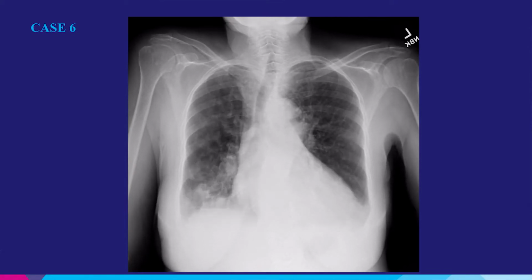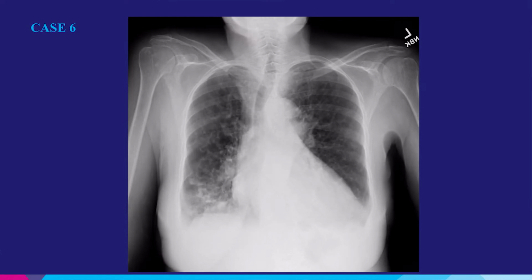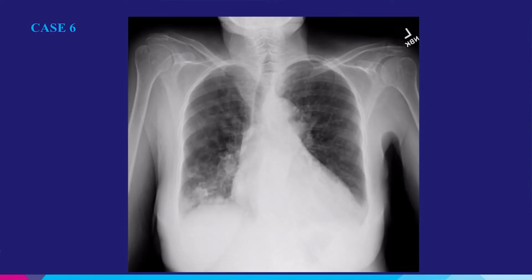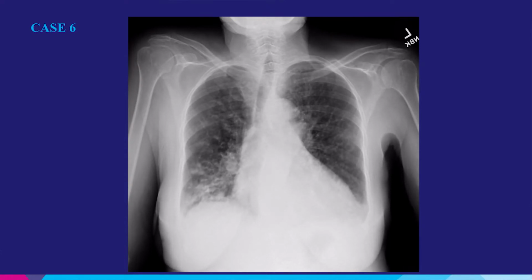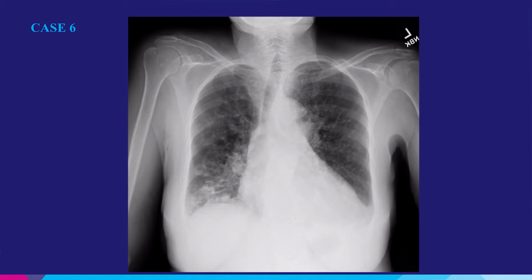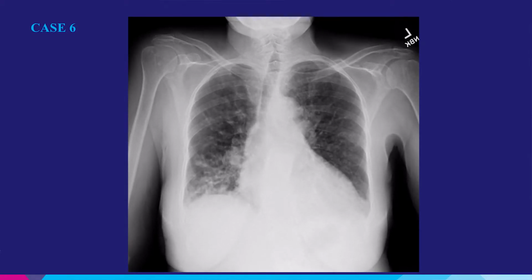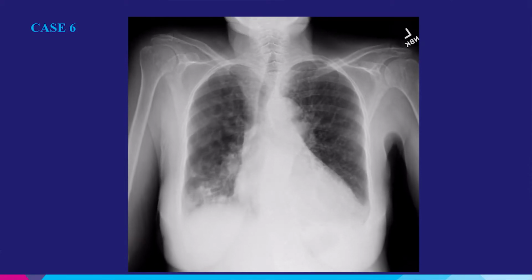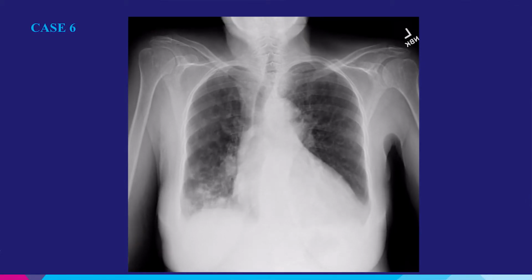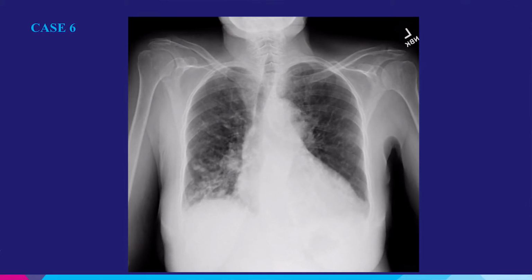We have increased reticulation, which was basically not definitive on static X-ray imaging, but here, with more information, we can more definitively say, well, this patient has bronchiectasis. And looking at these areas, one of the things is that when we see these patchy opacities, there's a usual differential diagnosis for them. It could be aspiration, could be atelectasis, could be pneumonia.